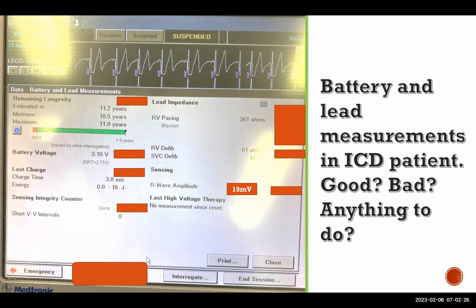Starting from the heart rate, I see it on the top left. It looks like 73 beats per minute. Right. What do you think about the sensing? Does it look right to you? It has a marker channel, where it's telling you. Yeah, looks good. There even looks like there's either a PAC or a PVC here, an early one. One of the things I'll mention is you notice how large this artifact is, which is probably an artifact of the T wave or repolarization. Yet the systems can distinguish between them.